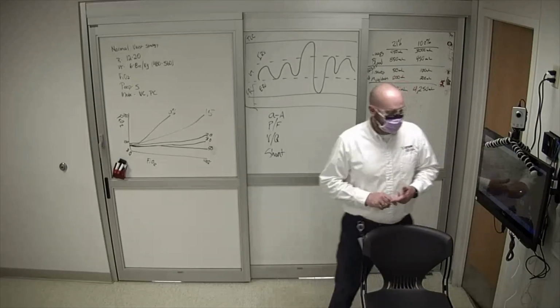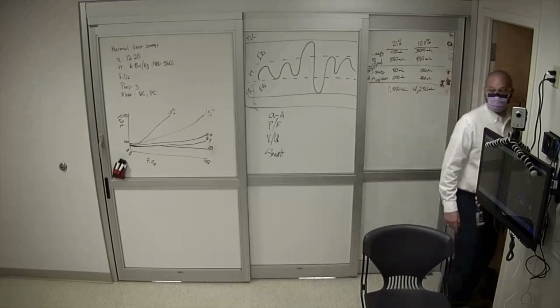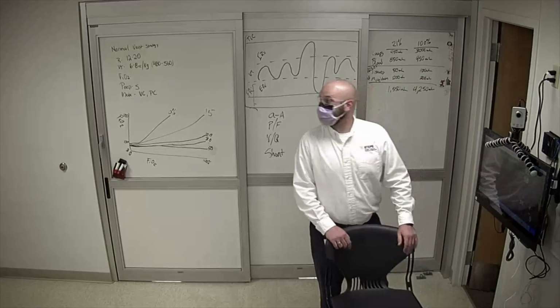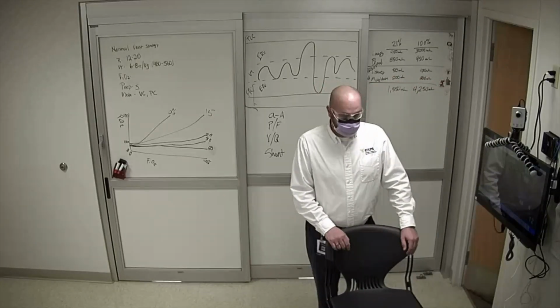All right, let's reset Stanley. Let's put him back to normal. I'm uncomfortable with his vent settings. Okay. Getting back up to. Yeah.